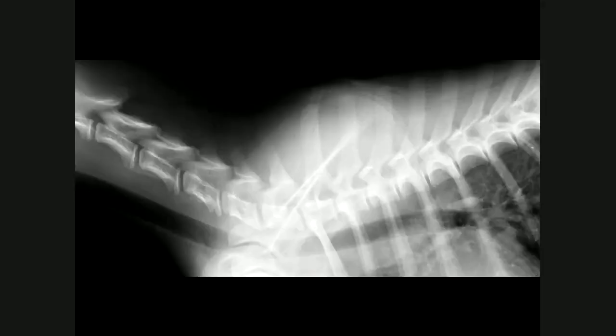So here's an example of a 5-month-old puppy that presented with neck pain. See if you can spot the lesion. And here the lesion again is very subtle. At this intervertebral disc space at C5 to 6, all we see is a narrowed intervertebral disc space. One can, in this case, again perform radiographs of the whole spine for a baseline and to look for other lesions further caudally. This is a young dog, and it should be small body size. So in this case, it could be quite easy to get into this region with an ultrasound probe and attempt to get a needle in there to isolate the infectious agent.